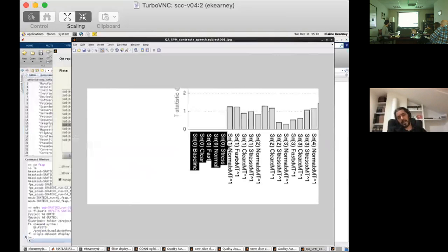That corresponds to that one particular column of the design matrix, actually looking at the interaction between the response time or reaction time within the normal condition for the first session, and it's modeling that interaction basically. What's session 0? Session 0 doesn't typically exist in a typical SPM design, but that's created by our scripts.